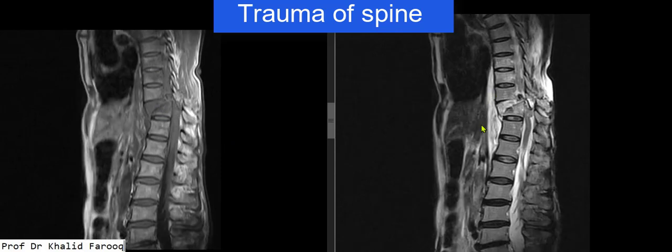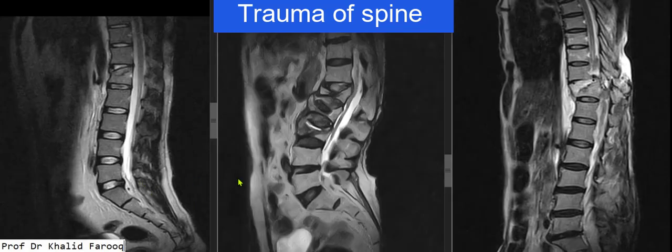We can also proceed with targeted CT scan for proper assessment of facet joints and regions of pars interarticularis at this level. Degenerative changes are noted in lower 3 lumbar disc levels, where tiny non-compressive degenerative disc bulges are noted in intervening discs. So this is an example of acute trauma with cord transection and grade 2 spondylolisthesis with bilateral facet dislocation and locking. So here we can see all three cases.